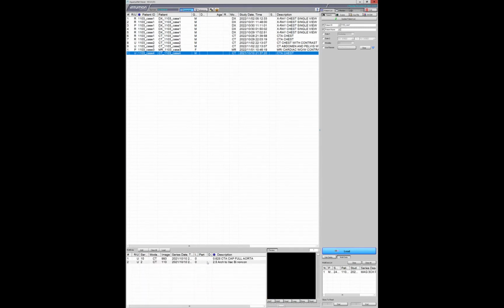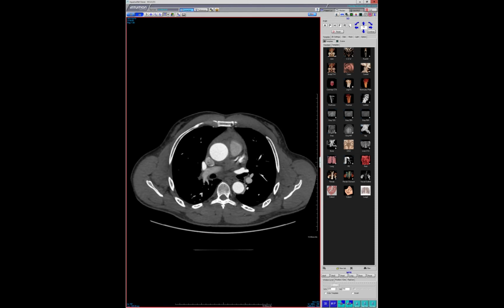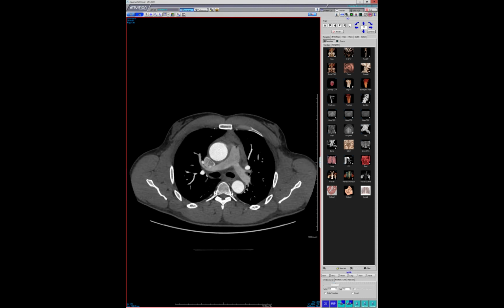I think Howard showed a case like this, and I just wanted to show our case that looked very similar. The case of the limited intimal tear, where there's this very focal lesion. It's funny, I wrote Dominic Fleischman, I showed him this case, and I said, I really don't like the term limited intimal tear for these.